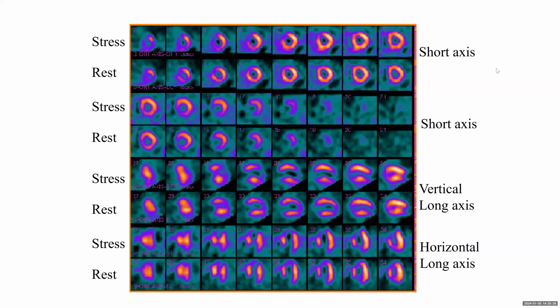Yeah, so what I expect is there is a mixed picture, so this is ischemia, but that apical fixed defect is a scar, and it's probably a branch territory too, which is a branch from the LAD territory that is completely scarred or occluded, while we still have an improvement in perfusion in the rest of the territory.